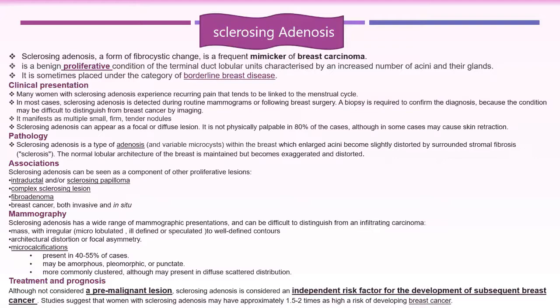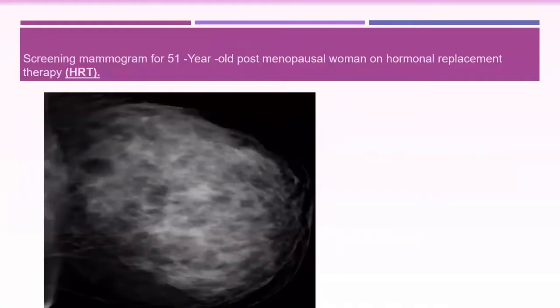Excellent. Okay. Suhair, can you see a lesion in this image?